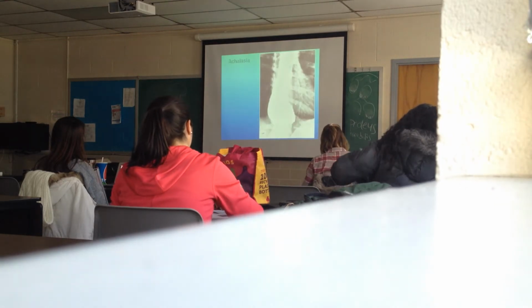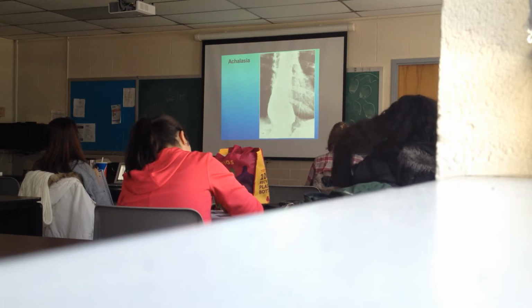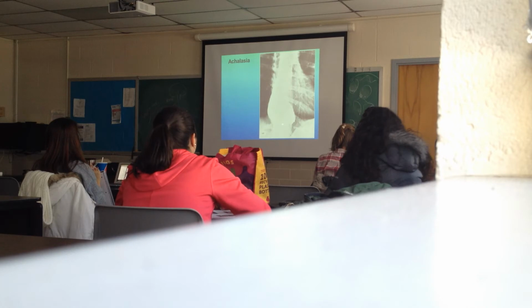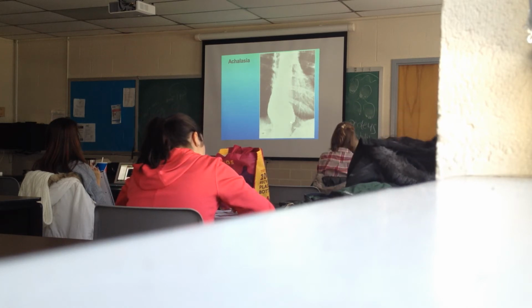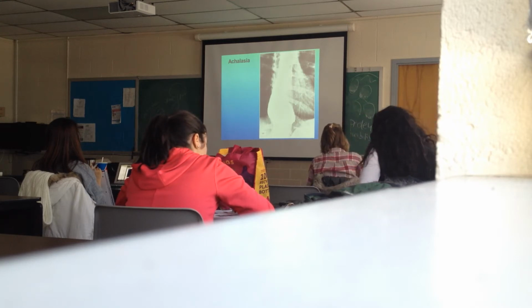Okay, normal radiographic anatomy of the esophagus. I'm going to identify the LES as the LES. Proximal stomach here. You should be able to recognize the radiographic findings associated with achalasia. Achalasia presents with a dilation of the esophagus proximal to the LES. The LES is right there, and proximal to it you can see the esophagus is dilated.